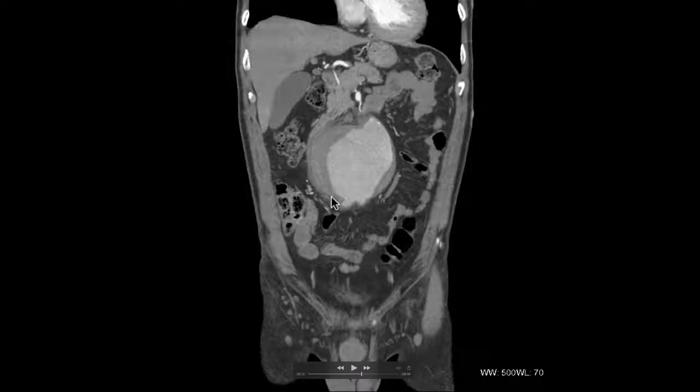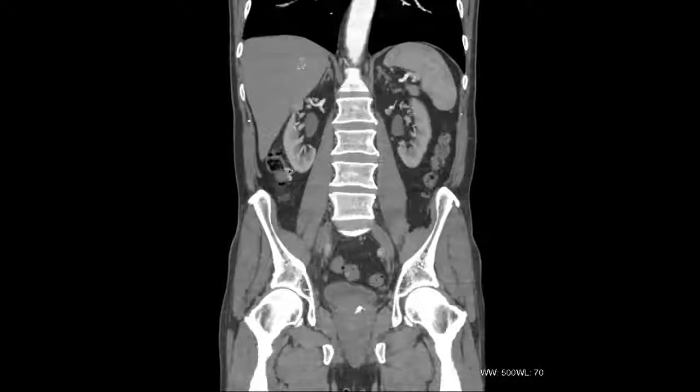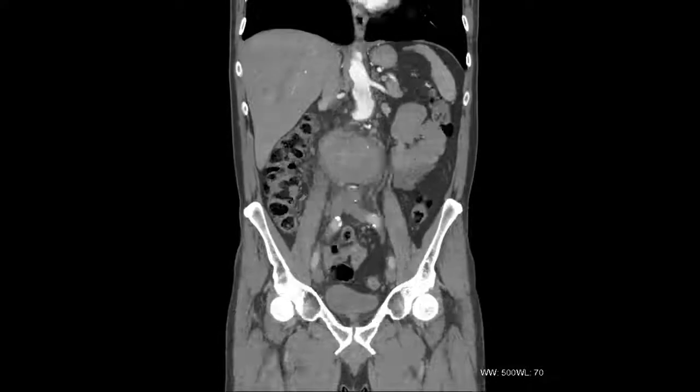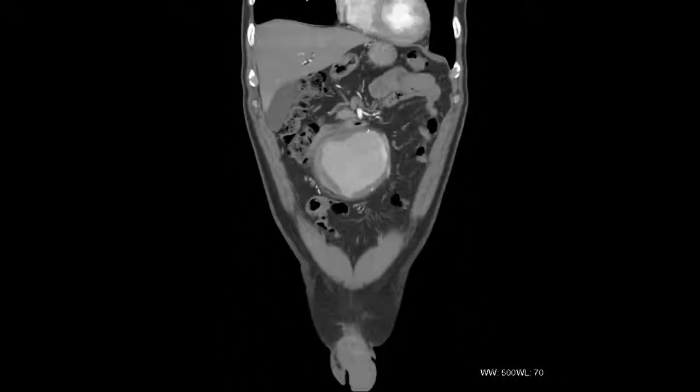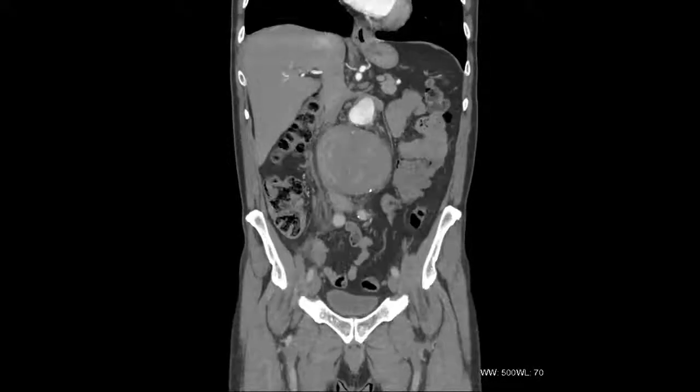So looking at a CT, we've got a system now for checking things. You've been going up and down, backwards, forwards, kind of making your own video from these individual screens. Is that the way to do it? It's not just one image, but go up and down. I think when you first start looking at this, it's important to go through one image at a time and look at it all really carefully. But as I was saying before, so much of radiology is pattern recognition and just looking at things over and over again. You'll find that as you get more experience, things will just jump out while you're scrolling through, because something you don't normally see will stand out, and so that's quite a useful way of doing it.